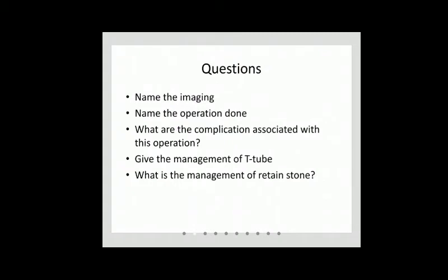Choledocholithotomy. Yes. So it is the choledochotomy or choledocholithotomy for stone in the common bile duct.